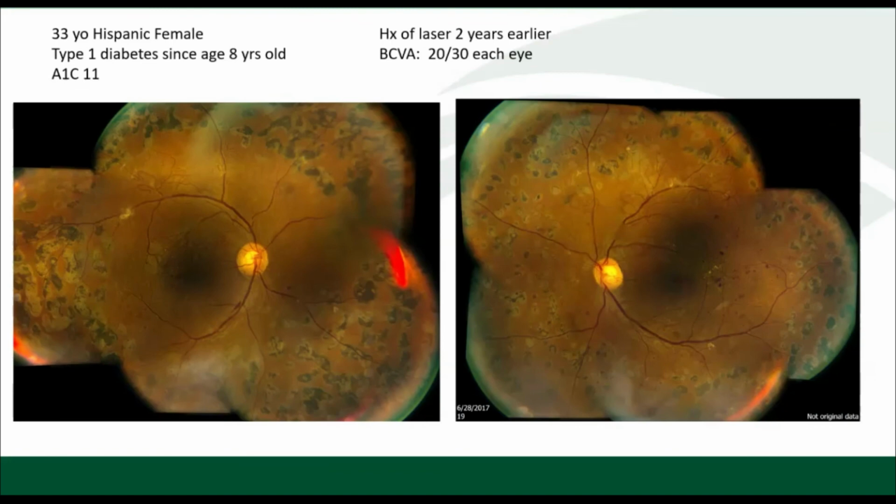And so I still see these patients, again, in a primary care setting. This is somebody who's, in a sense, fallen off the radar, if you will. Their insurance changes. They don't know where to go, and they finally connect with an eye care provider. And so you can see, I think, beautiful fundus photos of both eyes showing full panretinal photocoagulation in both eyes. And interestingly, a lot of times these patients tend to be pretty stable. I have a lot of these patients that I will see really twice a year. They've had laser 15, 20 years ago, and they're going along pretty well. The proliferative disease has essentially regressed. They've maintained good visual acuity.